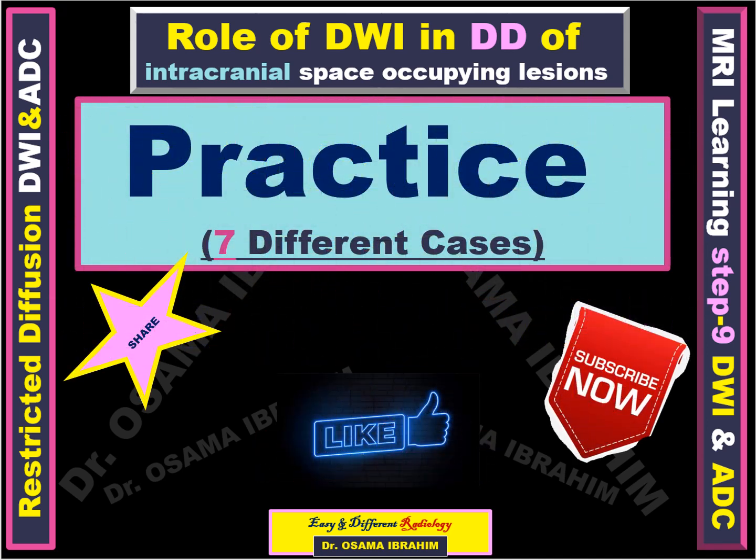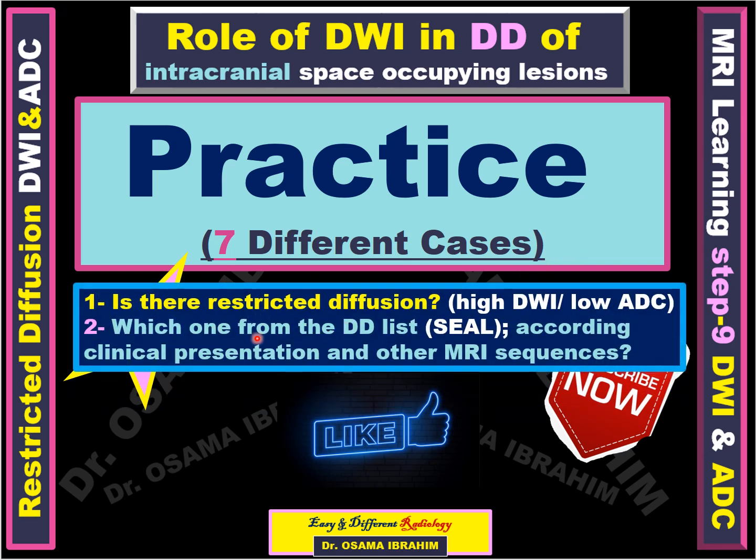Now my presentation is finished, but as I usually use practice cases to confirm understanding of the presentations, I will use today 7 different cases. The questions which should be answered today are: is there restricted diffusion signal, what is the meaning, high DWI and low ADC map, and which one from the differential diagnosis list, SEAL, according to the clinical presentation and other MRI sequences, to reach which one of the 4 causes of intracranial space occupying lesions which have restricted diffusion.